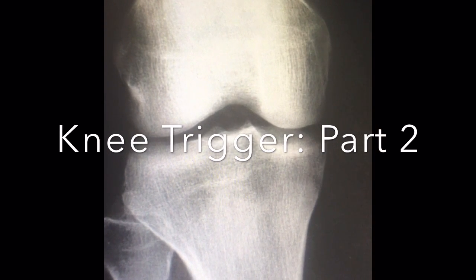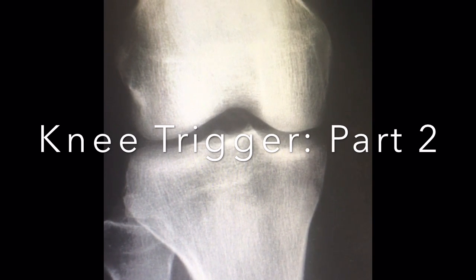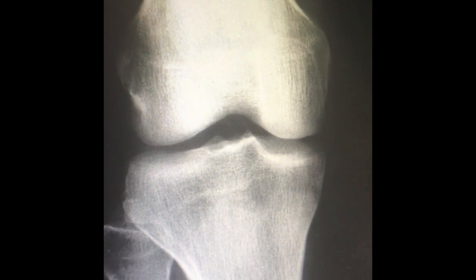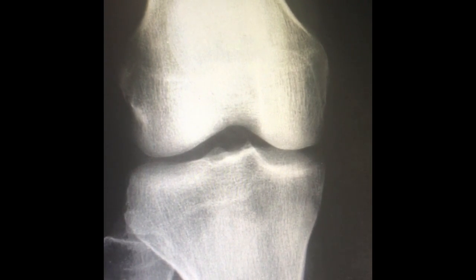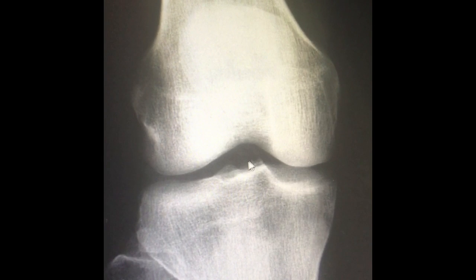Now moving on to my evaluation criteria of my images of the knee and technique for the projections that I just demonstrated as well. So starting off the AP knee image, we're just looking out for evidence of proper collimation, making sure that the knee was fully extended, just depending on the patient's condition as well. And I'm mainly looking that the entire knee is without rotation, and also can be found using the femoral condyles being symmetric and the eminence being centered in the image right here.